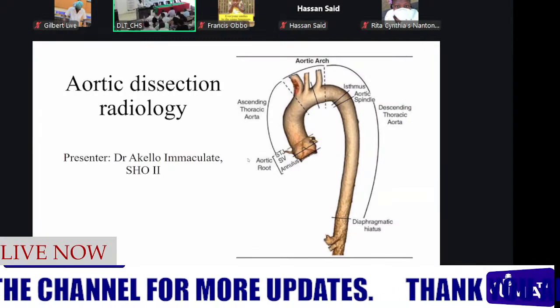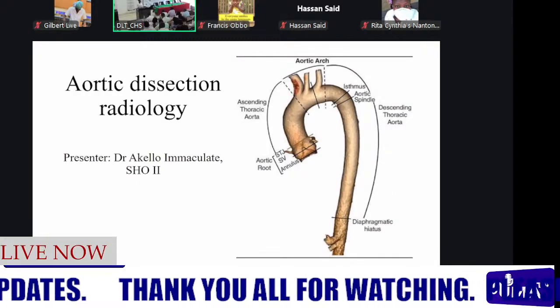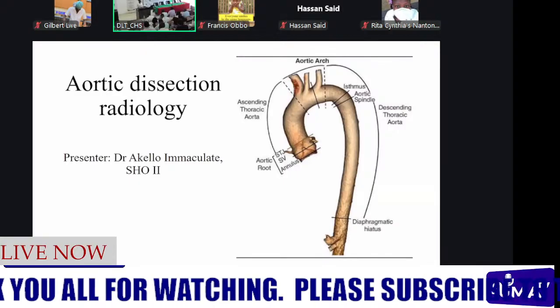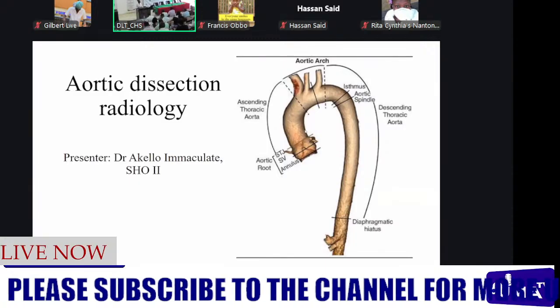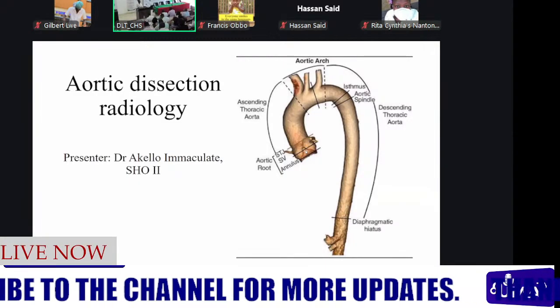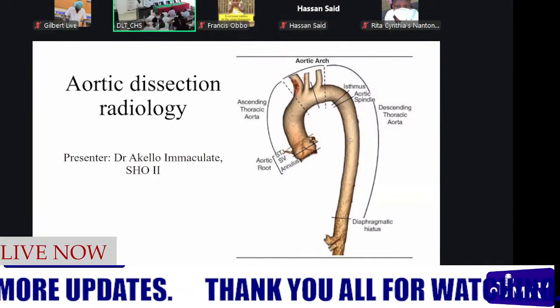So before we look into the images of the patient, I wanted us to go through this 3D volume rendered image of the thoracic aorta because it has different parts. I wanted us to orient ourselves so that we can relate very well when we are looking at the patient's images. So the thoracic aorta has 4 different parts. We have the aortic root, then the ascending aorta, the aortic arch, and the descending aorta.